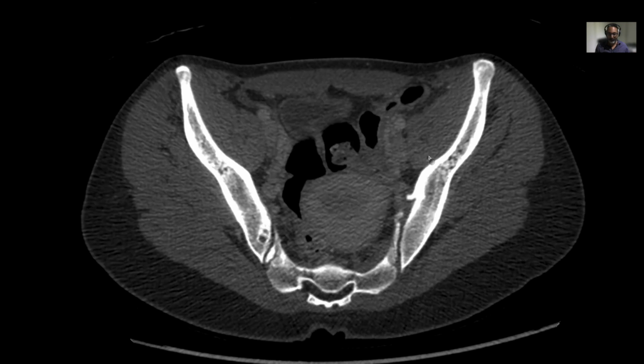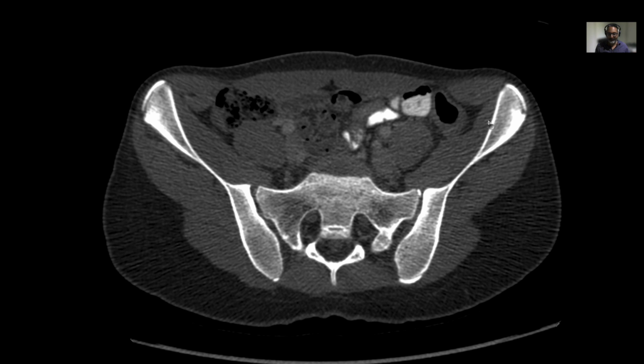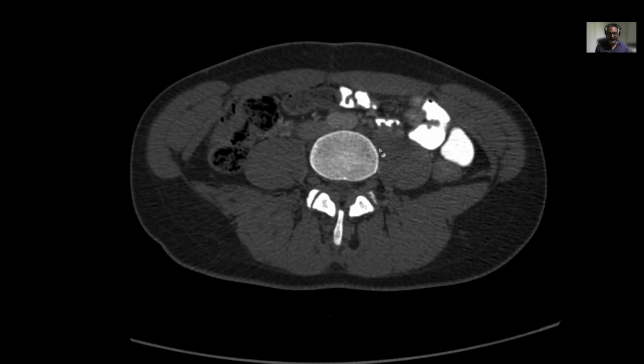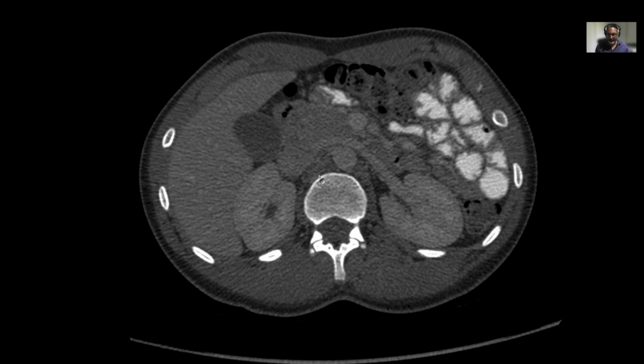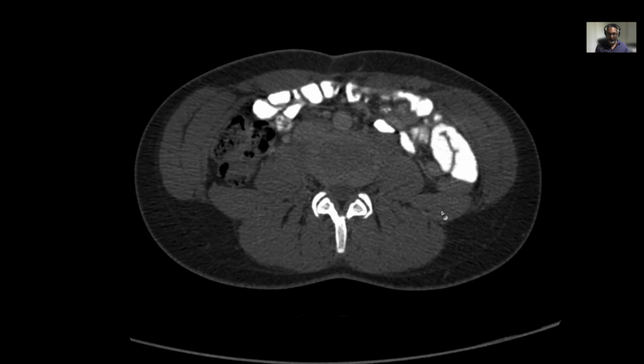So let's pull it back. That's the psoas, that's the iliacus. The iliacus stays in the iliac fossa. The psoas keeps moving up, and you can see it attaching to the medial aspect of the lumbar vertebrae until it just vanishes. There you go. So the quadratus lumborum, which is this one, and the psoas major.